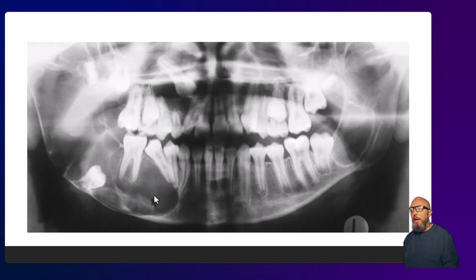One other thing I'll point out before we get to the differential, we can pretty much diagnose it from this, right? It's never a final diagnosis, but I can pretty much tell what this is. But look at the expansion of this, the expansion pattern. It does look like a multilocular lesion, so we got our macho acronym. Is this more ameloblastoma or OKC? Well, look at the expansion up the mandible, kind of that banana-shaped expansion where it's really following the length of bone with relative little either buccal lingual, in this case we can appreciate more the superior-inferior expansion, and that's more your OKC than it is ameloblastoma. So this is likely multiple OKCs. This is basal cell nevoid syndrome, pretty much a diagnosis based on the radiograph. Hopefully you got that one.